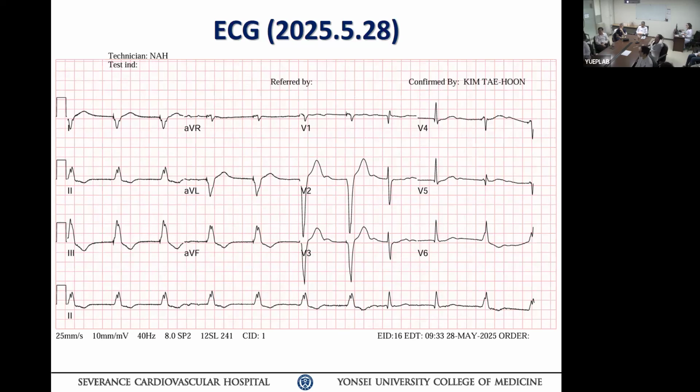We're going to have to ask a more senior person now. What is this EKG? Look at lead V1. Is it acceptable? I don't know if it's a CSP, but if this was a CSP, since this is teaching for fellows, in V1, what should you see? And you see that?